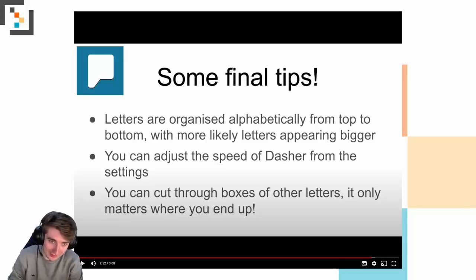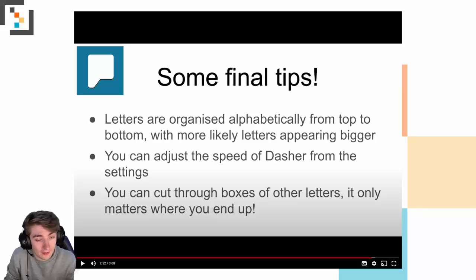Okay, I hope you enjoyed that video. Some key things to take from it are that, again, the letters are organized from top to bottom alphabetically, with more likely letters appearing larger. Another thing is that you can customize the speed of Dasher from the settings, so once you start to get to grips with how Dasher works, you can really speed up that typing process.